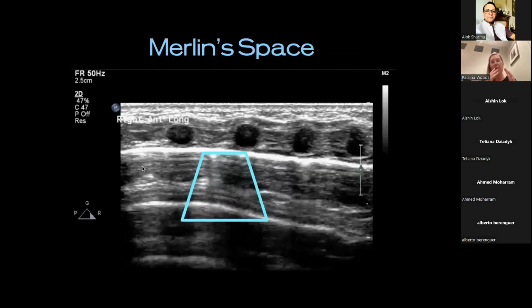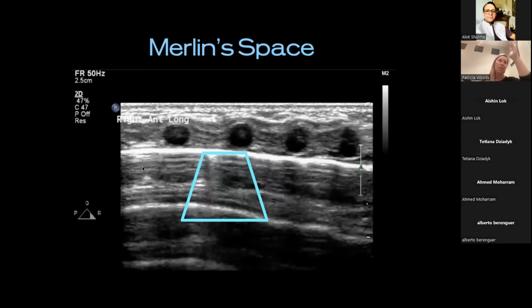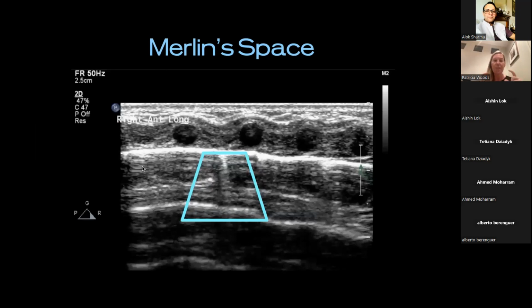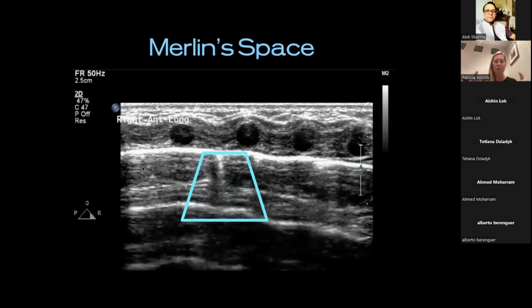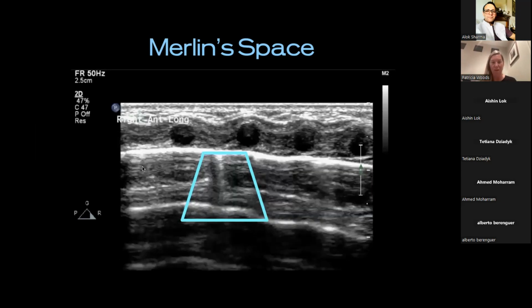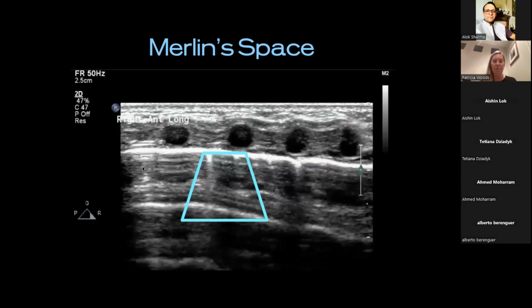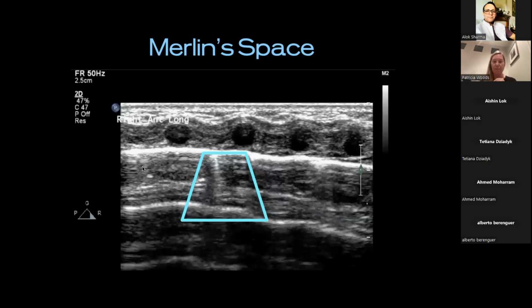So this is something that's exemplified when we use M mode. Just remember M mode of movement across the line with time as you go forward. And some people, way more clever than I, have come up with the terminology here, Merlin space. So really starting at that pleural line, coming down by the borders of the acoustic rib shadows, basically the bit of artifact area. Remember, you're not seeing lungs. You're looking at artifacts generated at the lung surface. So they turn this Merlin space, but it's just so you hone in and tune in. What's happening here? Is there sliding? Is there B-lines presence? What's going on?